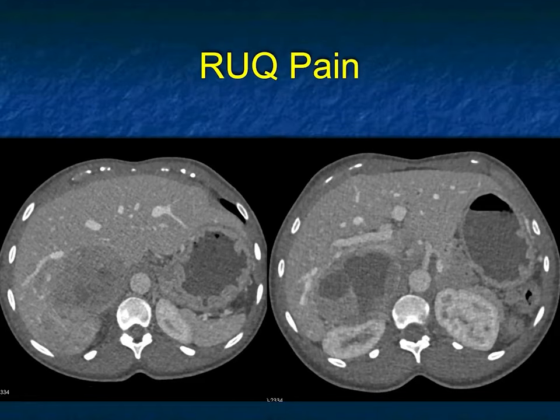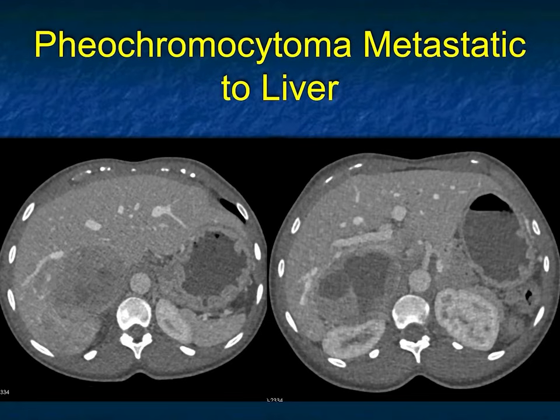Simply get metanephrine levels. If they're elevated, you're dealing with a pheo. And in this case, it was a pheo. The patient also has a subtle lesion right lobe of liver. There were other images, obviously, in this case, which showed liver metastasis. But remember, that doesn't help me that much because both pheos and ACCs can be metastatic to liver.